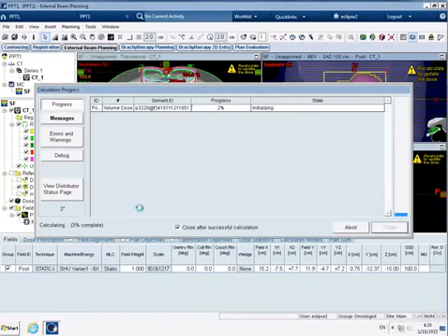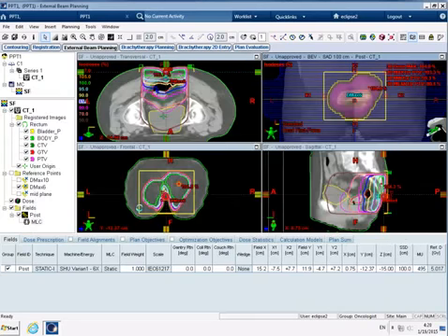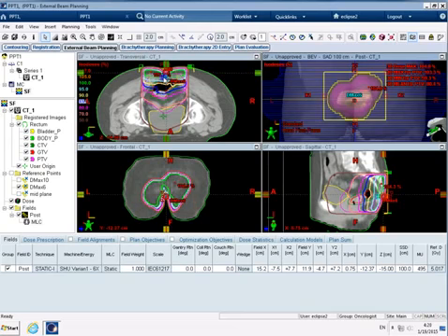Okay, so I've just adjusted that field and I'm doing a last calculation there. Once you've got to this point, let's have a think about the quality of this plan. We've said ideally we want to treat a minimum of the PTV with 95% of the dose, and we've said here that this is a 95% isodose and only a small portion of it is actually receiving that dose.